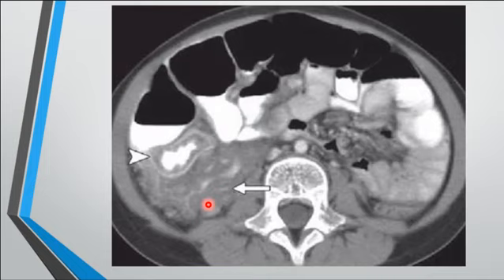So there's an adjacent soft tissue mass in the right paravertebral region. There is no history of infection or inflammation. White blood cells are normal. Yeah, it's not an inflammatory condition. It's a mass. Can you think of anything? Okay, I'll give you a hint. He has some cutaneous problem. This is a neurofibroma, exactly.